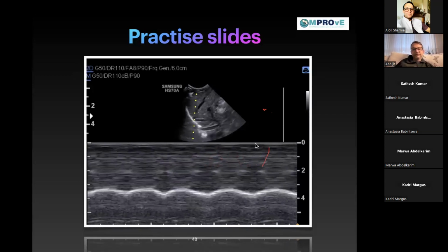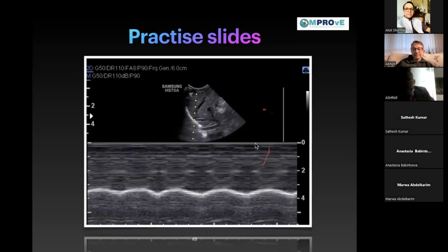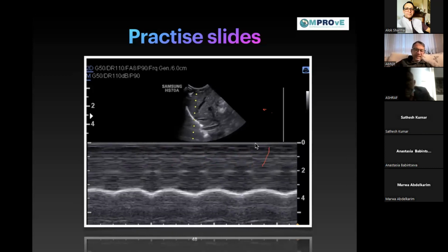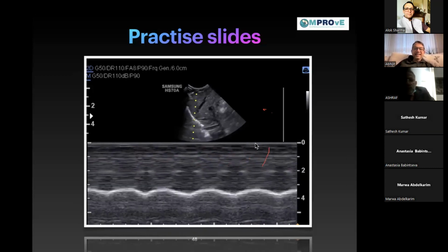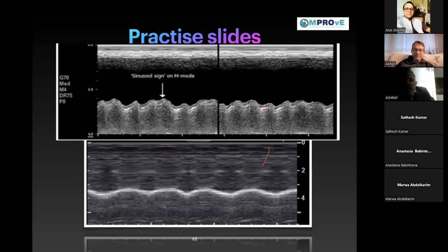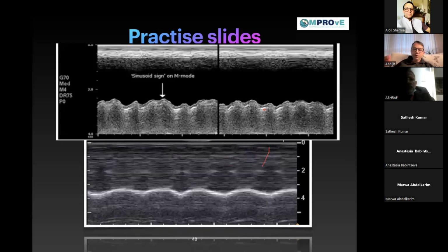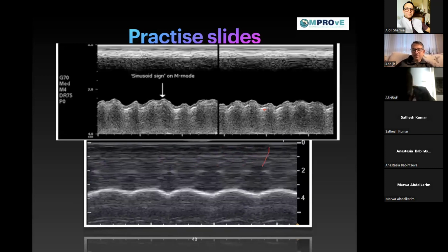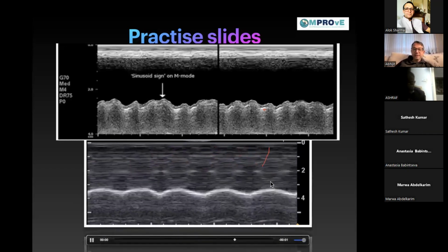Anyone? This is the diaphragm. Diaphragmatic excursion. Function of the diaphragm. Diaphragm thickness. Sinusoidal movement of the diaphragm during respiration. Yeah, you guys are experts. You don't need me. Right, so this was a trick slide. Well done, guys. And why I have put it here, not to trick you, of course, but to show you the difference between how the pleural effusion and the normal diaphragmatic excursion look. You guys are already ahead of me, you know it.